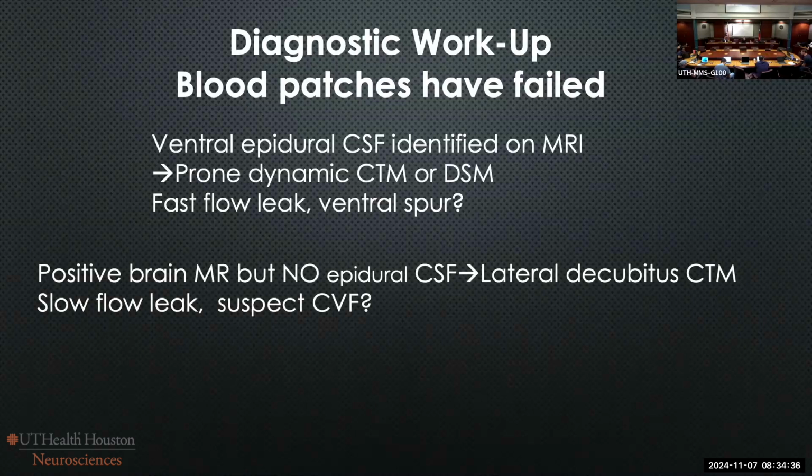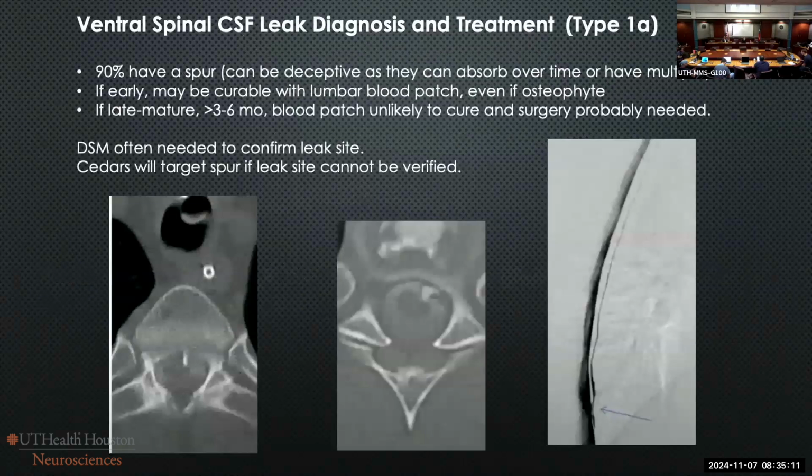I've also seen a couple of MR myelograms, and they're not nice scans. They're not like what we're seeing here. I don't think we need the myelogram. I feel very comfortable with the T2 that we can see the CSF around when it's out, with our T2 STIR. I don't think we need the myelogram and the MRI. That's something the literature suggests, but not everybody's doing it. We could start making it happen. It's really a simple sequence, and you can see it in the structural imaging very well. So it would be nice to have a protocol for it.